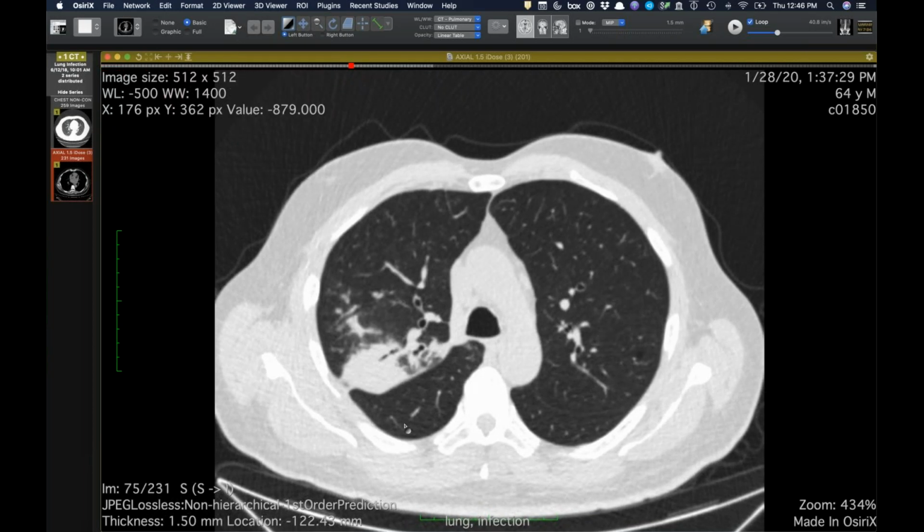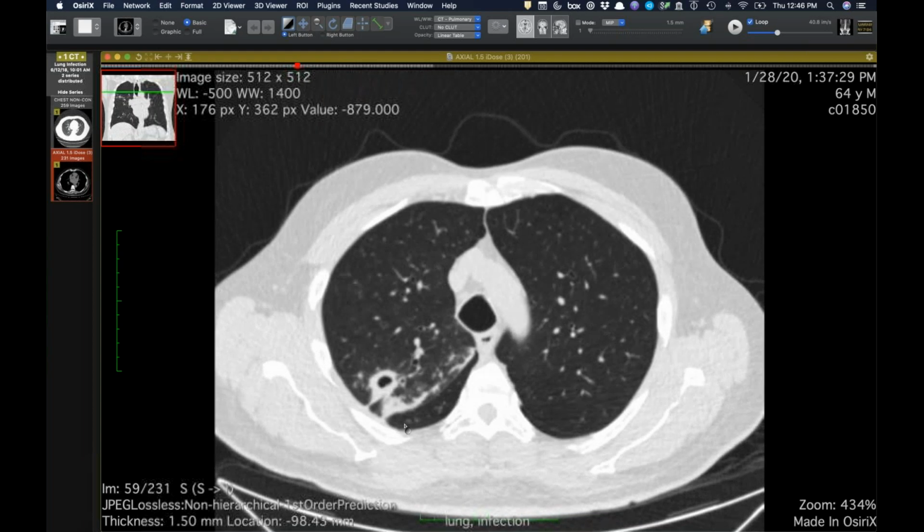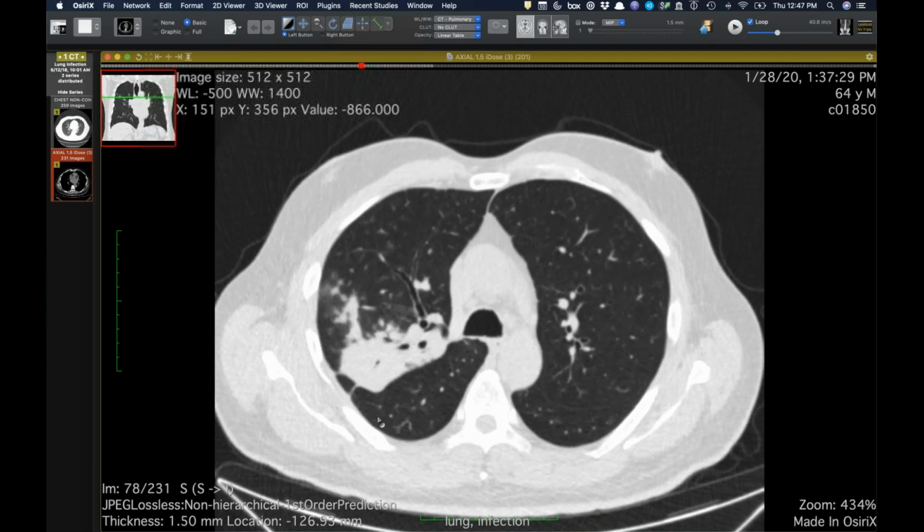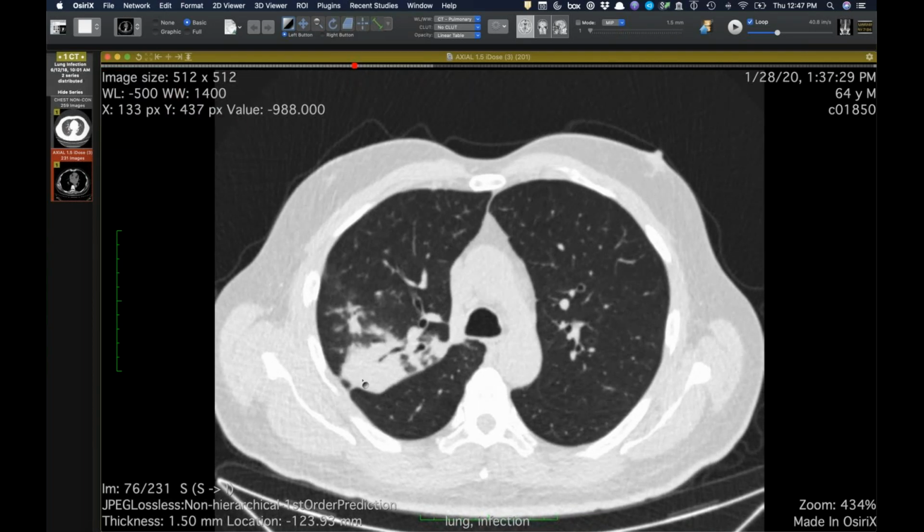I don't know. I mean, I usually say 2S and then just say it's most likely an airways infection. Right. That's my practice. I'm curious what you guys do, because there's a lot of debate. Even in our section, there are people that will call 4s on all of these. I only call it a 4 if I think it's probably going to be a lung cancer, and that does not look like lung cancer. That's not a 4. I mean, you're saying that's not cancer. No, I know, and then some people, and it's not 4. Yeah, that doesn't make any sense. Yeah, I've talked to Costa and Sanjeev about this, and there's a lot of debate elsewhere. So I was just curious how others deal with this.